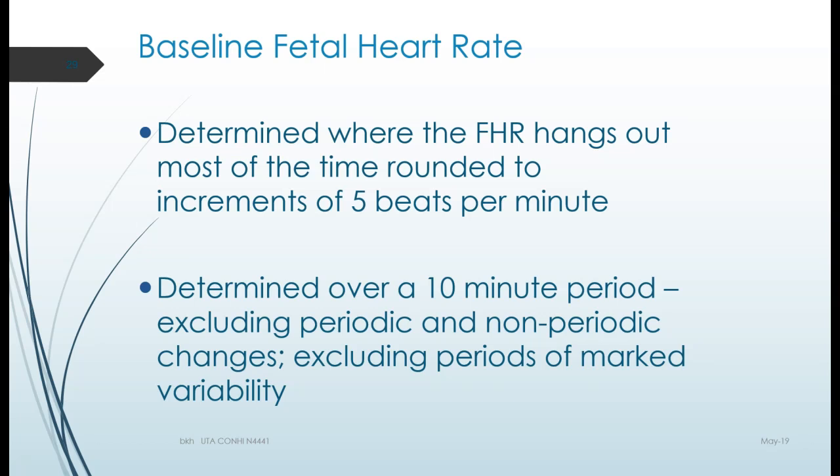When we're looking at baseline, we have to look at baseline when there are not any contractions happening and when we don't have a period of a big increase in fetal heart rate, like an episode of acceleration, or some type of a deceleration. And you're going to learn to define those. But to start with, the easiest way, and I think I told you in part 1, to learn how to look at this fetal monitor strip is go one page at a time and let it build on top of each other so that by the end, this is going to make sense.